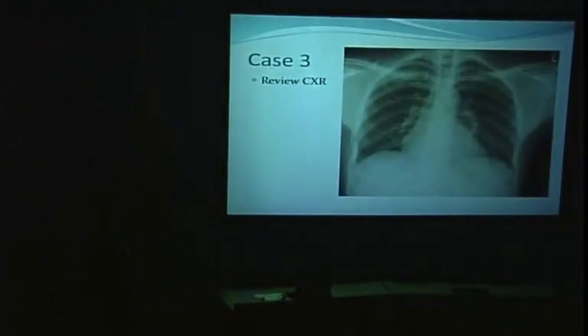So let's go back to this chest x-ray then. See, the left hilum did look a little bit bulgy, but most of that is actually soft tissue. The end of this rib here is not clearly seen. Likewise, there is, in retrospect, an increased density here anteriorly behind the clavicle. If you compare with the other side, it's subtle and grey, but it's there. There was a bit more there than we actually saw. You can actually see the start of the scoliosis there. T12 is just about visible.